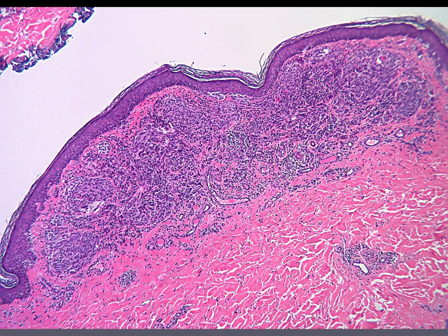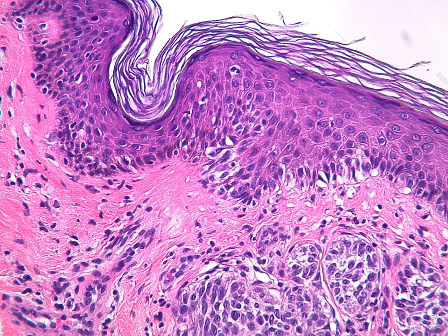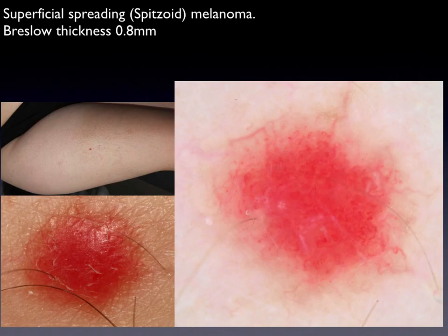So here's the dermatopathology of this lesion. Superficial spreading, spitzoid melanoma, Breslow thickness 0.8 millimeters.